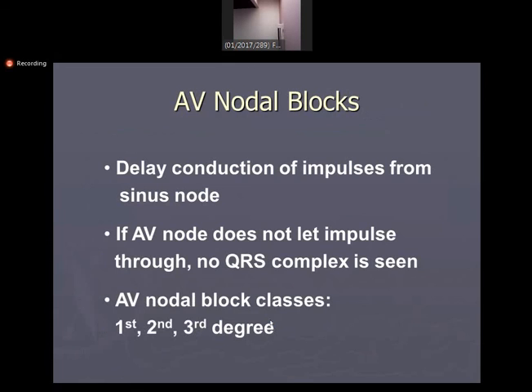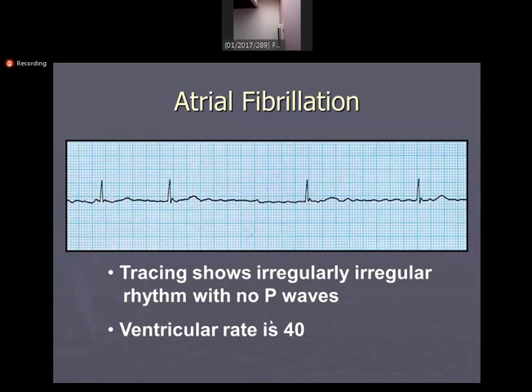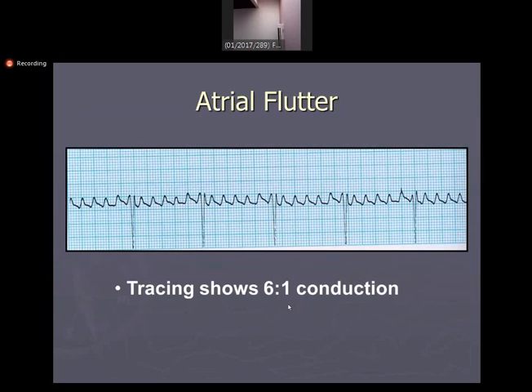What is atrial flutter? It is an abnormal rhythm, or an arrhythmia, which generally occurs in some disease condition. And in this condition, what happens? The atria depolarize multiple times, but the focus remains the one. For example, if you see this slide, how many times is the atria depolarizing? 1, 2, 3, 4, 5.